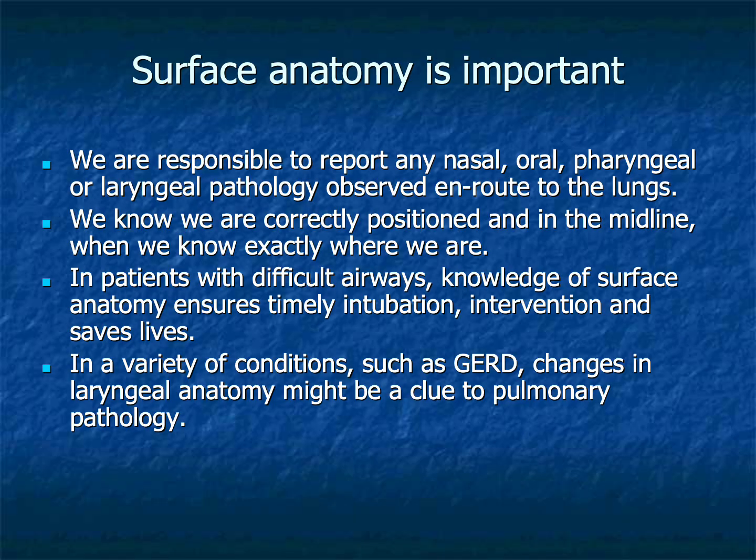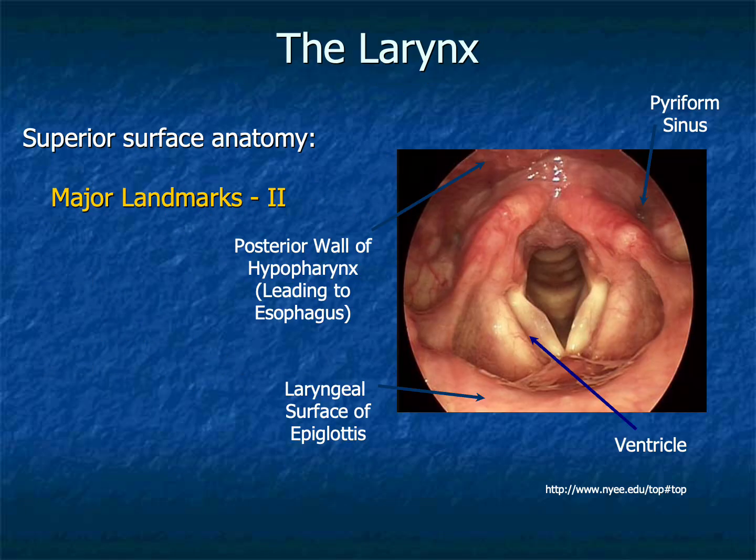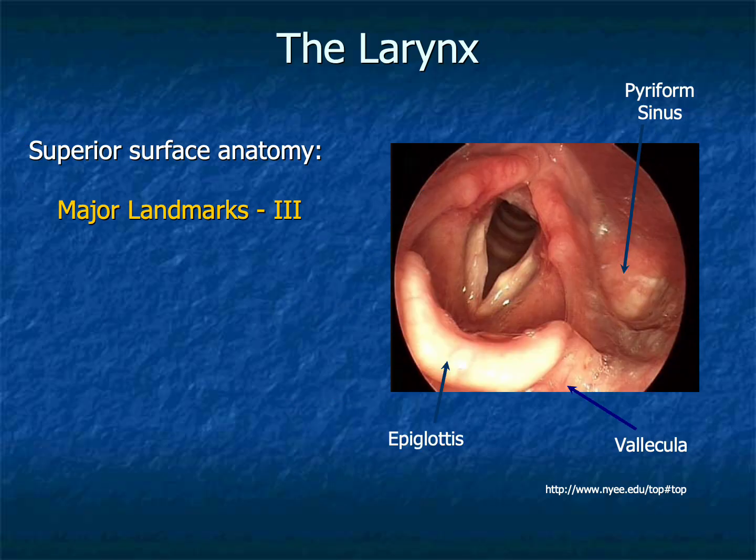But expertise develops through repeated observation. The bronchoscopist learns to recognize subtle distinctions in contour, color, symmetry, depth, and motion. The vallecula becomes recognizable as a space rather than a shadow. The vocal cords are dynamic structures rather than static tissue folds. The ventricles and commissures acquire anatomical meaning.